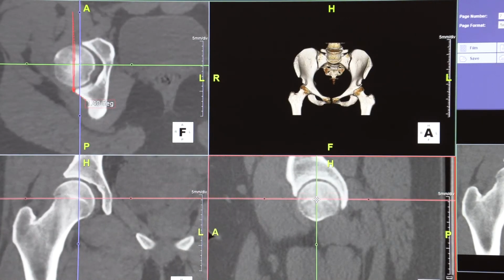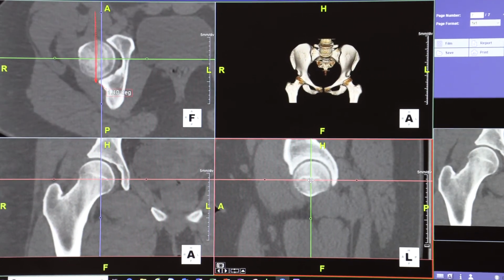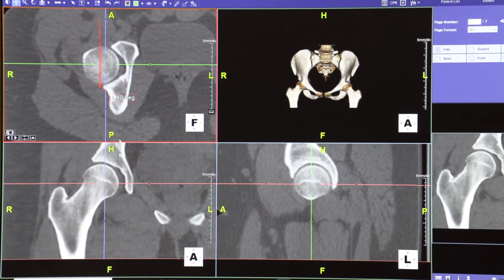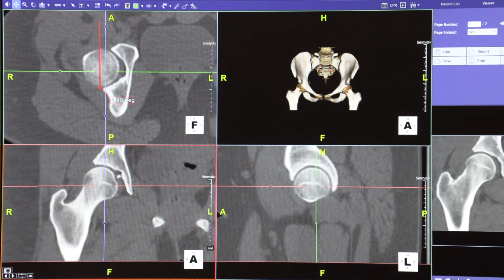Then we go to 3 o'clock, which is here, which is right about this physeal scar, and that's where you should see the fovea also. In this case, we are not seeing the fovea much because the fovea is also high. That's called fovea alta. You can see this fovea, it's kind of higher than that plane. Usually you should see a fovea at 3 o'clock.